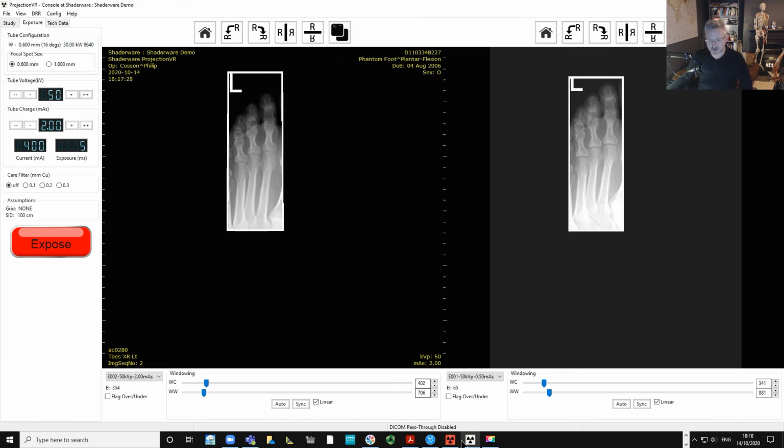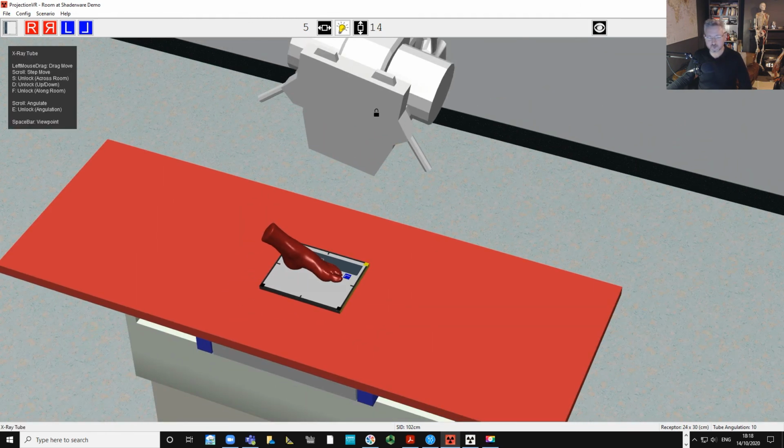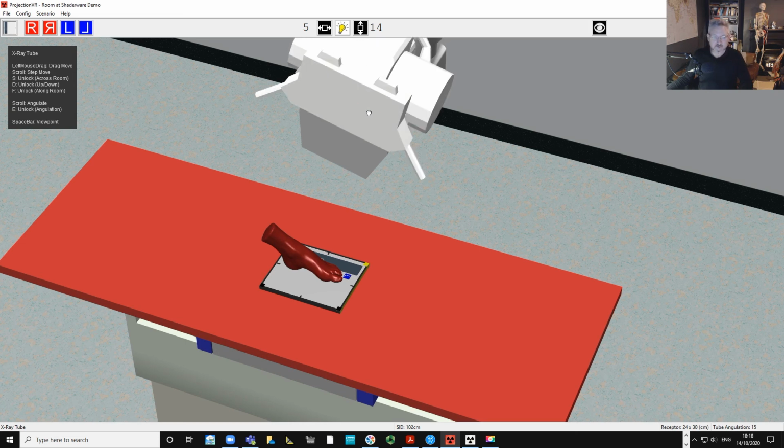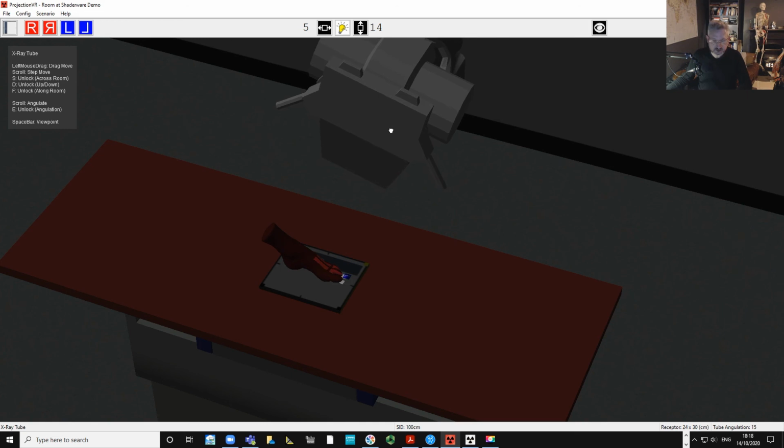And what we can do is we can just try the 15 degrees and see whether that makes it worse or whether we've gone past the optimum. So scroll and go to 15 degrees, which was the other alternative, and get to 100 centimeters and bring this across to center in the right location again.